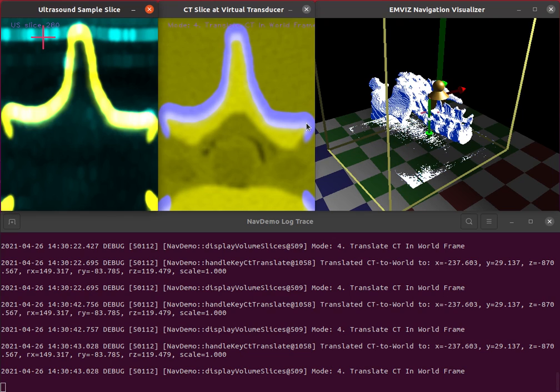So what I've done for this new algorithm is extract just the bone edges that the transducer would see. This is the first bony edge that the transducer sees from top to bottom. And again, that's also dilated. The purpose of dilation is so that the search is a little bit less sensitive, so that when you're close, you will start to get a signal, because the search doesn't do you any good if you only find something when you're right on top of it.